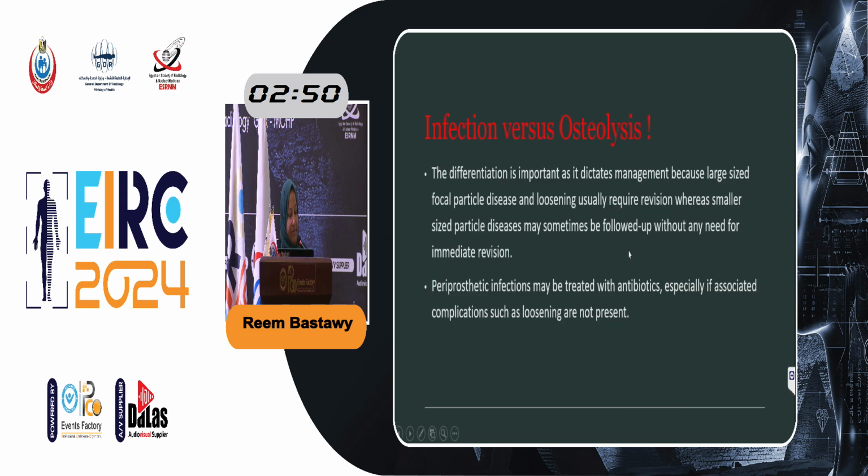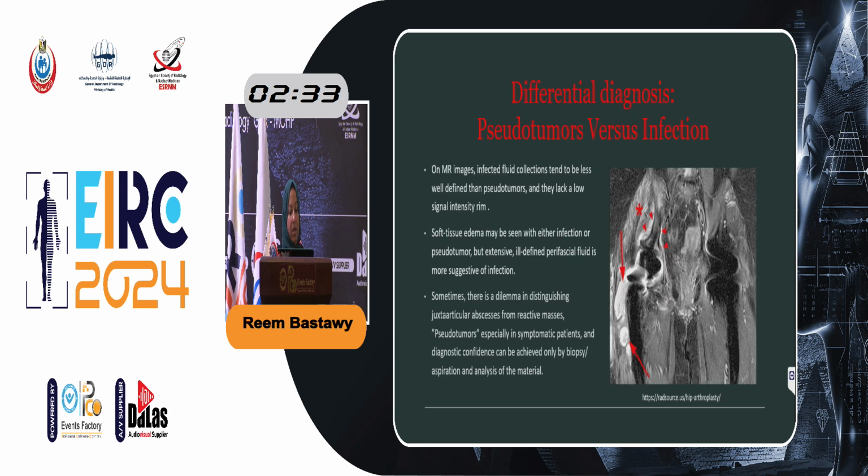The differentiation is important between infection and osteolysis because the management will be different. In cases of large particle disease and loosening, this requires immediate revision. Small particle disease may be treated conservatively, and of course for infection we need antibiotics and another type of therapy.